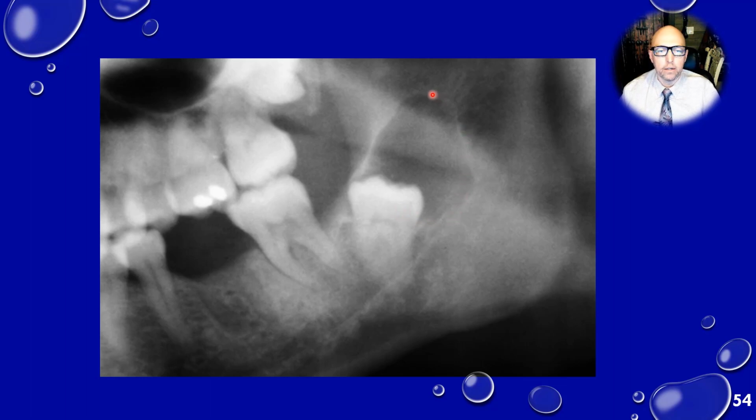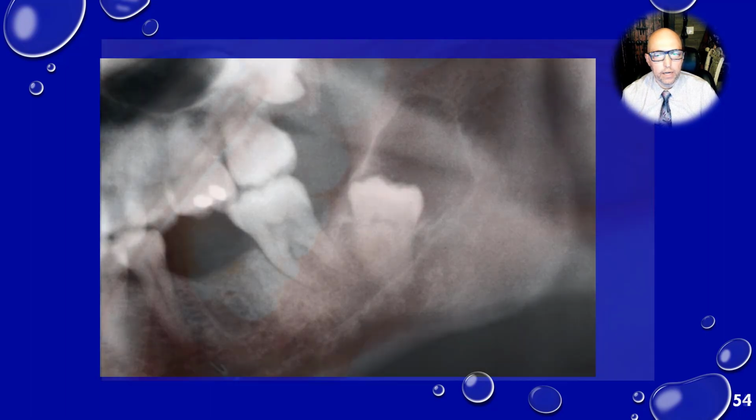That's a pretty rare lesion. They used to be considered a variant of OKC, and radiographically really difficult to distinguish the two. Really, that's a histopathologic differentiation, whether this would be OKC or OOC, which stands for orthokeratinized odontogenic cyst. As I said, really similar to OKC, used to be considered a variant, but I don't get too much into the details of an OOC, because I think if you say OKC and it ends up being an OOC, radiographically, you're pretty much right on.